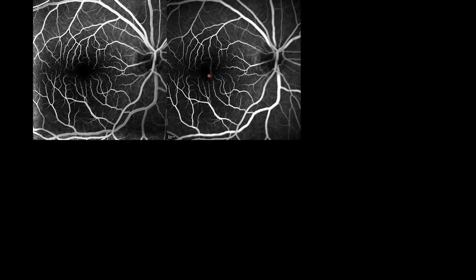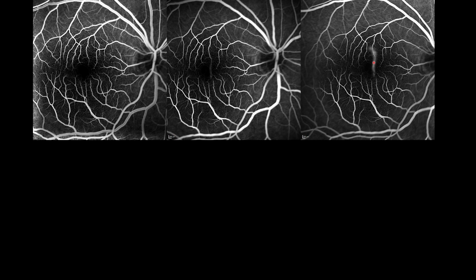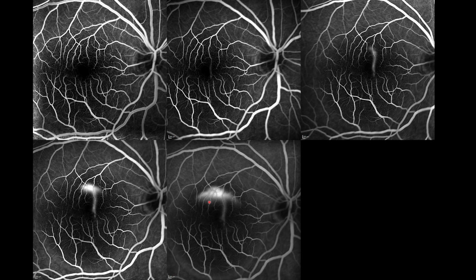And let's see if this increases in intensity and area. So you see the next image, you can easily make out that it is increasing in area. So it is spreading and also increasing in whiteness. So the intensity is also increasing. So it's a leak. So next you look at the next picture. Now you can see this has spread even further, almost like an umbrella. So this is what we call a smokestack leak. Now if you see carefully, it is getting localized. If you look at this boundary, the dye is now slowly pooling into the area of retinal detachment. So this is a serous retinal detachment, that is a CSR.